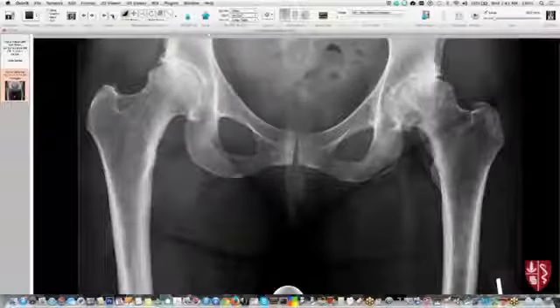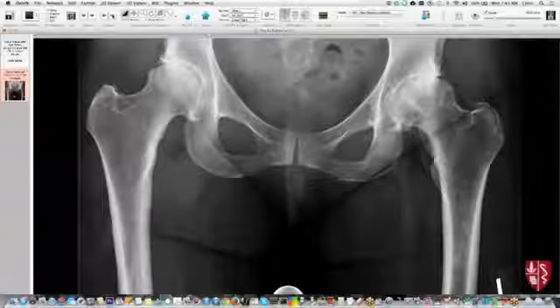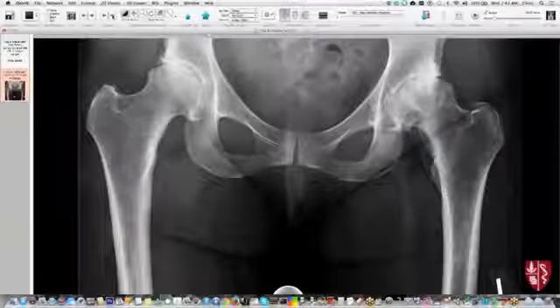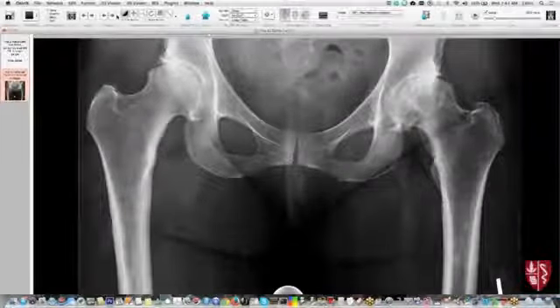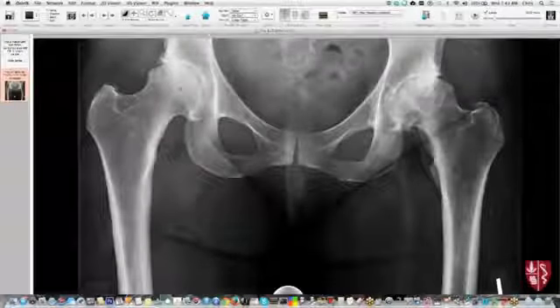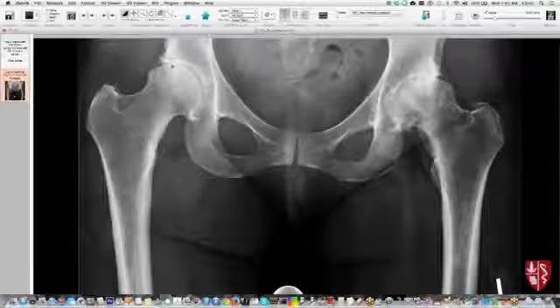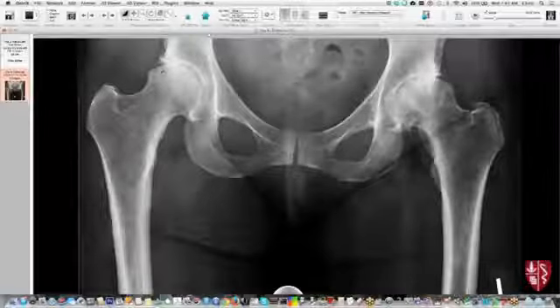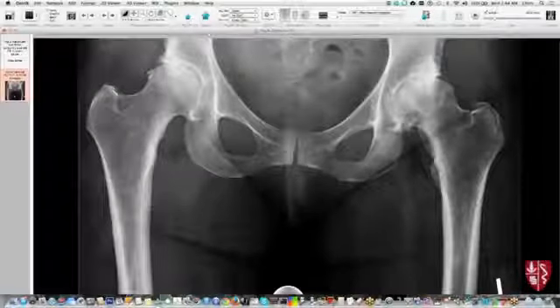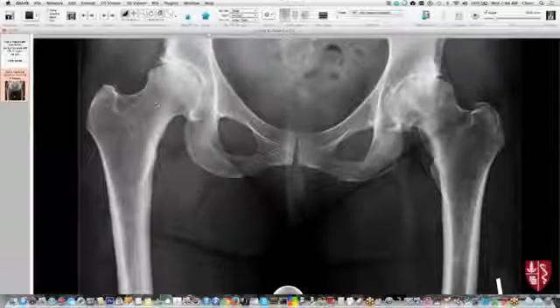Take a look at this example. So this is kind of classic bone board 101, right? So here's a patient coming through the orthopedic clinic, and this is a fairly classic manifestation of osteoarthritis, right? So on the right side here, you have kind of asymmetric narrowing of the cartilage space. See how it's thinner here than here, maybe a little bit of osteophytosis here and here. And that side's fairly mildly degenerated.